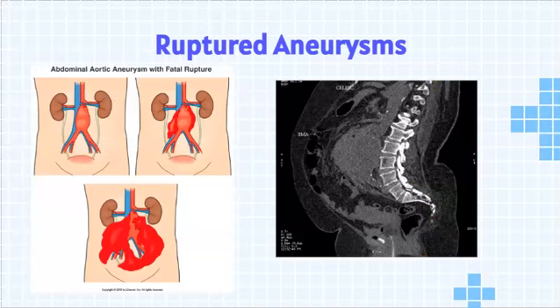And then here we have just our normal aortic aneurysm. Can you all guess what type of aortic aneurysm that would be? To me, it looks like a true aneurysm. So we have that symmetric outpouching, or that symmetric enlargement of our aneurysm, and then it's also infrarenal.